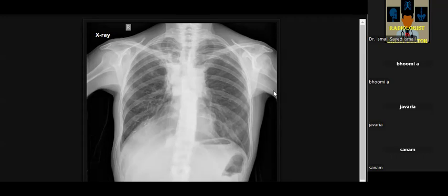Okay, but first comment on the lines and the tubes. Yes, sir. This is a central venous catheter, a peripherally inserted central catheter, present at the area of the atriocaval junction. Non-anatomical lateral border opacity centered on the mediastinum with apical fibrotic changes, reduced both lung volumes, and surgical clips. This is most likely related to breast cancer with radiation.